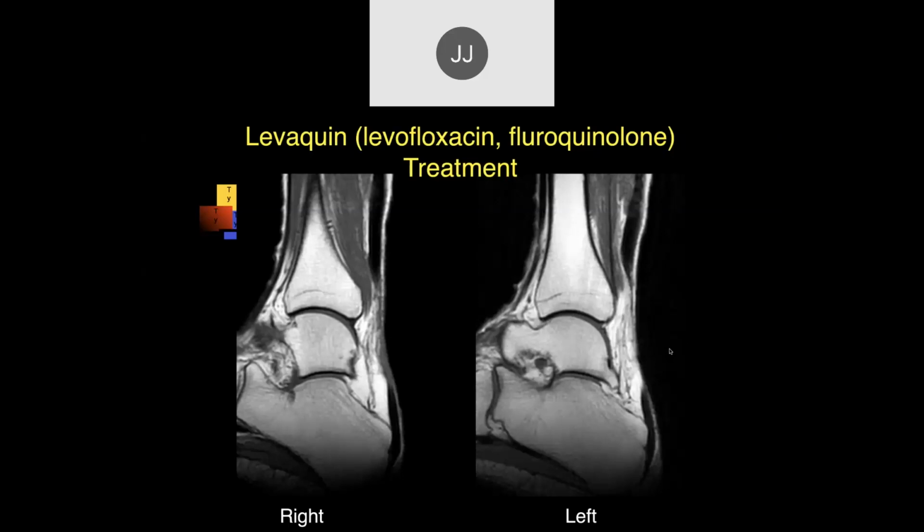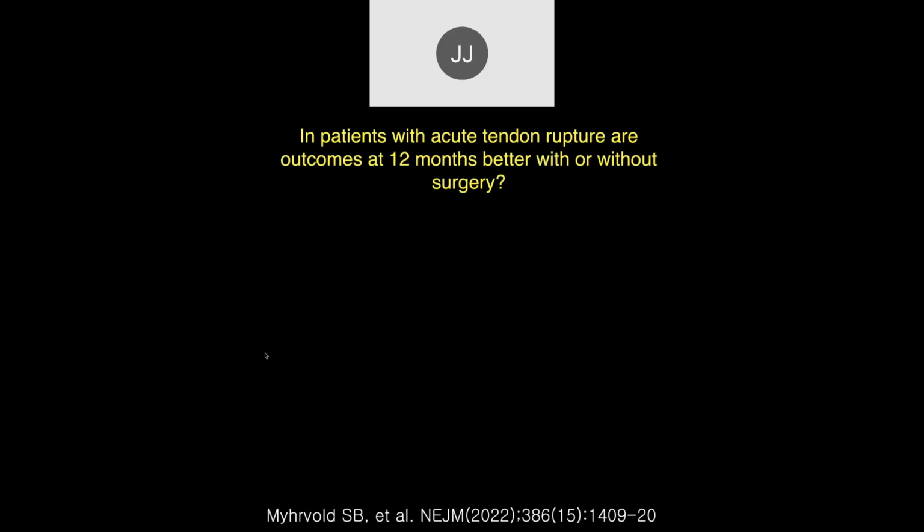I suspect this to be a little bit of a cavus foot. What do you think, John? I'd need to see it more distally. It certainly could be, or it could just be that this patient is extended because the Achilles tendon is insufficient. I'm not sure. I'd have to see the rest of the foot. I'm looking at the plantar fascia, a little dense. Yeah. We just need to see a little bit more of the bones to differentiate that.